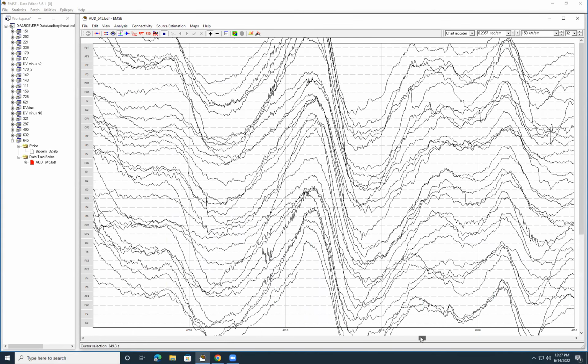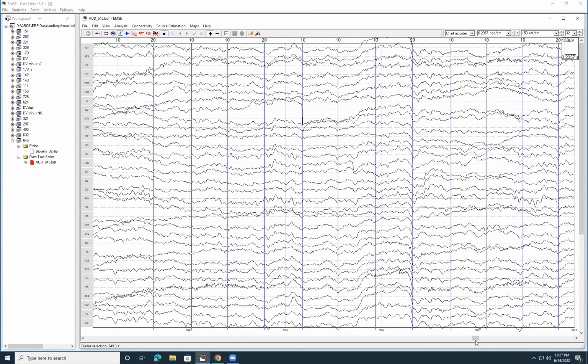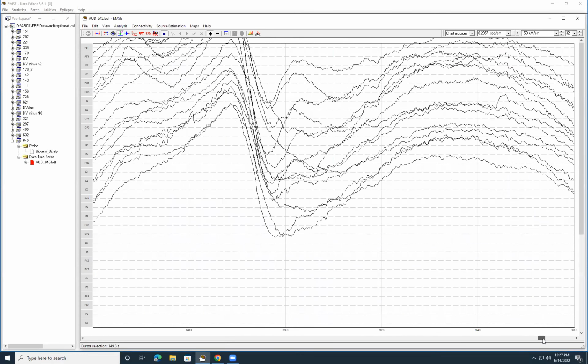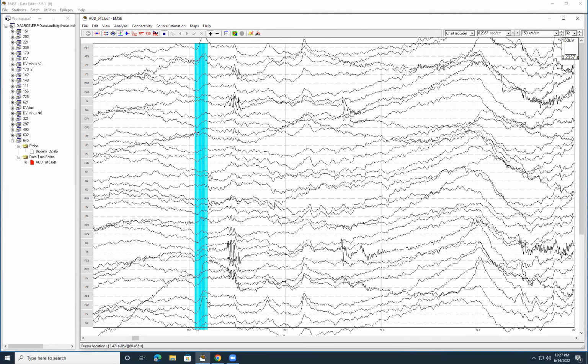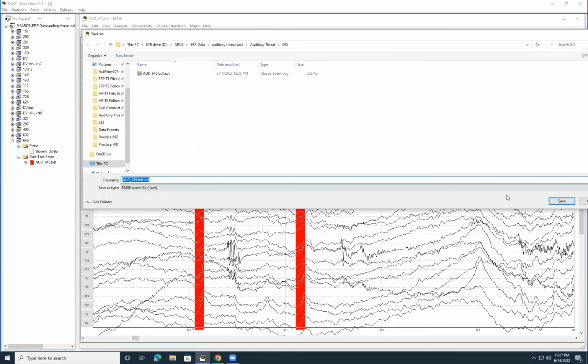Skipping around with more. Oh wow, a lot of movement here. How was this visit? Was that difficult? Oh, there's some movement. Something happened there. All right. Not the best blink examples, but we'll take it. All right, that's enough of those for this example.